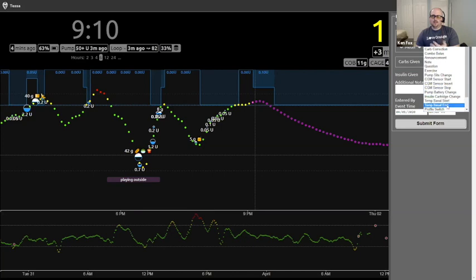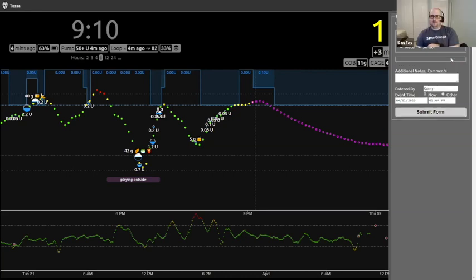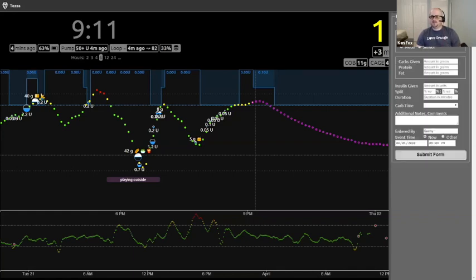If you got really crazy before you were looping, you could have done temp basal logs, which I did, which was crazy. But what does announcement do? Announcement, for us, I don't think it does much. I think the announcement, I don't know for sure, is used for when you announce your carbs in Open APS, but you don't want to actually log them. You just say, I'm starting a meal. I think that's what that is, but I honestly don't know. It's newer, I think. Combo bolus is newer too. That's new. That wasn't there before.